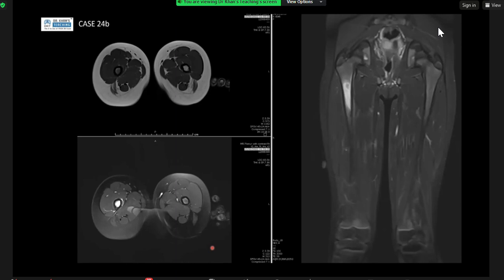I see that in the right femoral shaft, proximal diaphysis, there is a T1 enhancing area at this region of periosteal reaction. There's no cortical break, there's no adjacent soft tissue mass. So if the patient has raised inflammatory markers, this could represent osteomyelitis, the central hypointensity could represent osteomyelitis.